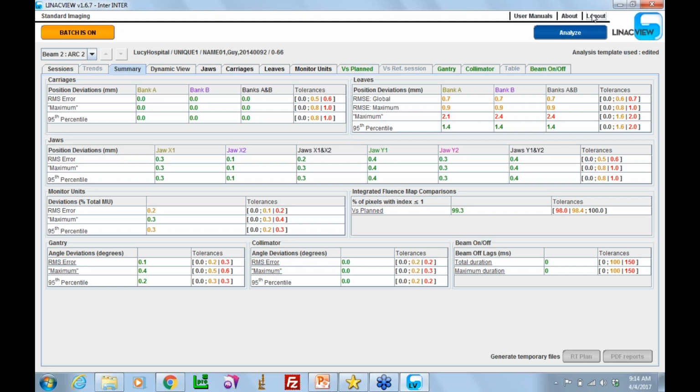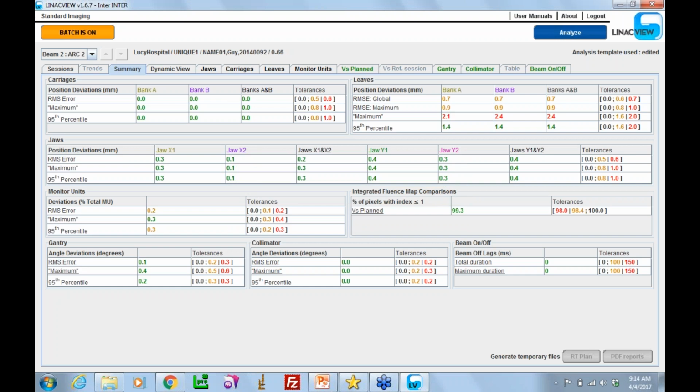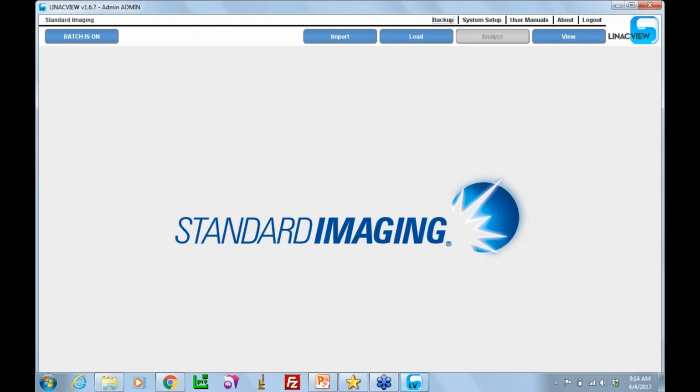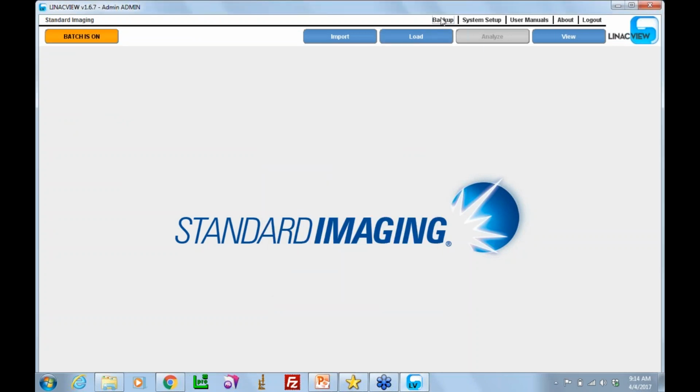So I'm going to log out here. Okay. And I'm going to log in as a physicist. And what you'll see is you get a little bit more information. You get the ability to back up the system.